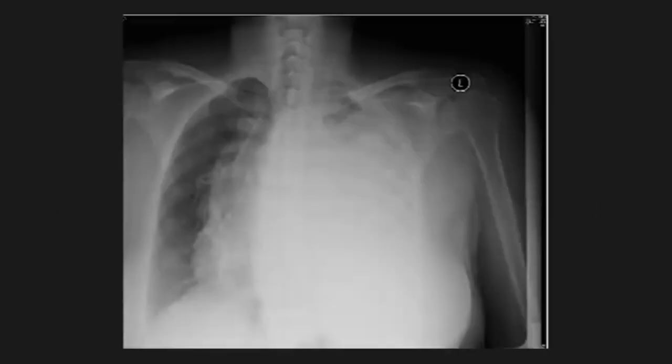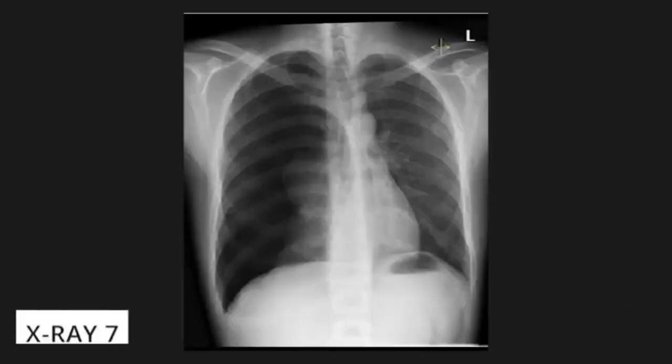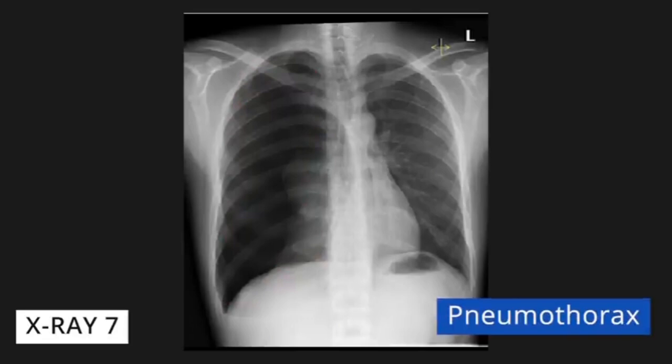Let's hit A for airway. We're looking at the trachea. We're looking for a shift. Dr. Madan uses this great push versus pull mechanic. How does that work? If you have something taking up space in the chest, like fluid or high pressure air, it pushes the trachea away to the healthy side. But what if the lung collapses? That creates a vacuum. It actually pulls the trachea toward the injury. So the windpipe basically points a finger at the problem.